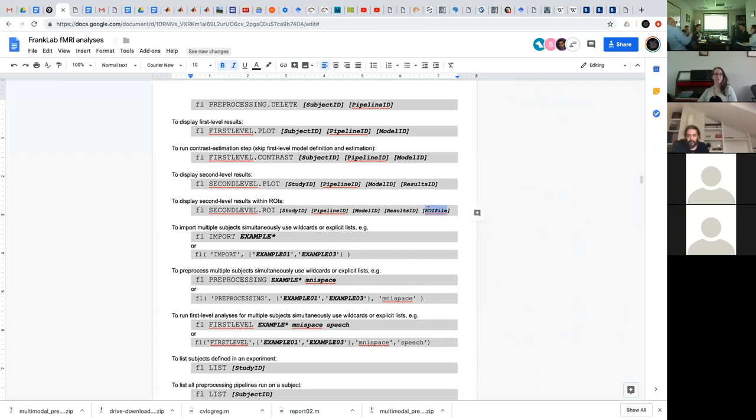You could have them all labeled on that surface, and then you just input a link to this labeled surface, and then the list of the indices that we want to include in our ROI analysis. That would make things easier potentially from a file management standpoint. Because I think right now we have to come up with one file per ROI.